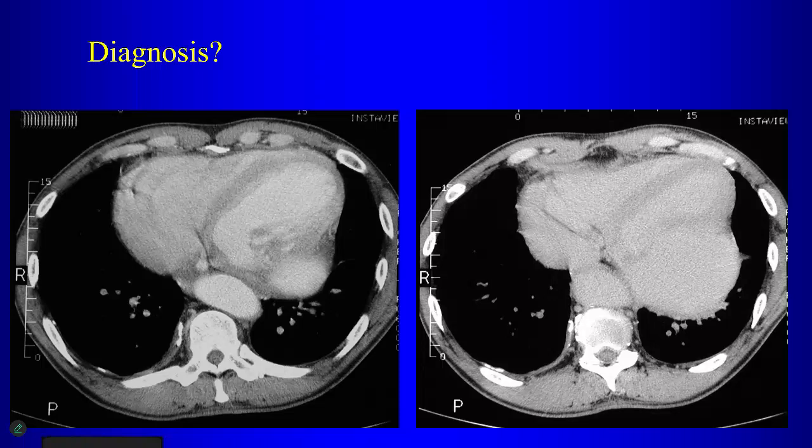So the difference between true aneurysm and false aneurysm: a false aneurysm is a perforation of the myocardium, and it's contained by pericardium. So these are surgical emergencies if it's acute, right? And how do we differentiate them? Well, we look at the mouth. That's probably the best way to do it. Wide mouth is true aneurysm, narrow mouth is associated with false aneurysm. In this case, you can actually see the myocardium, right? So you can see that the myocardium is here, and so this has to be pericardium.